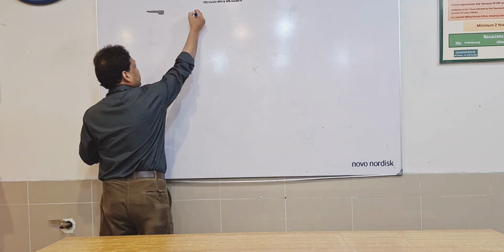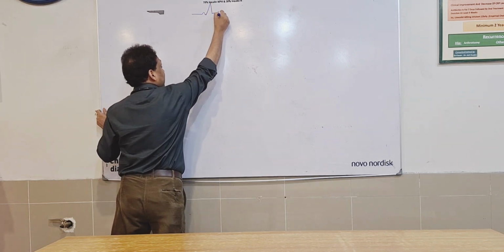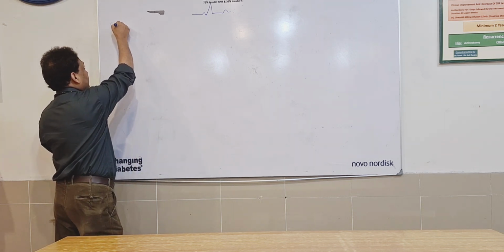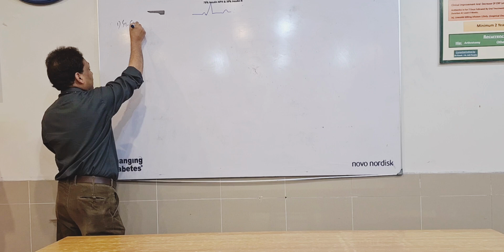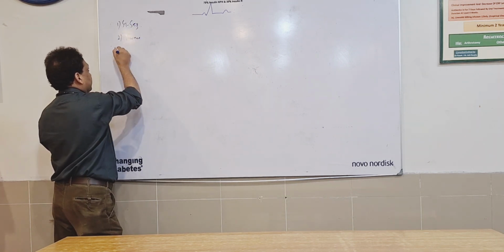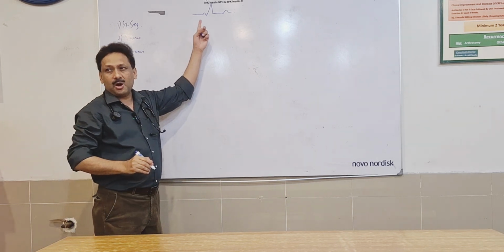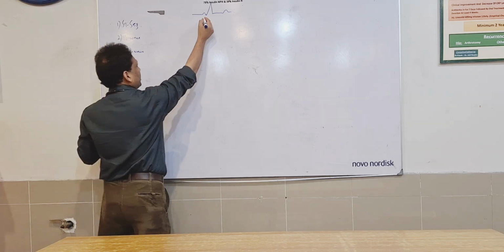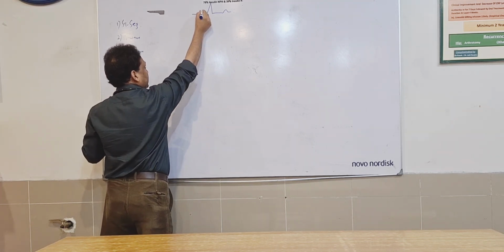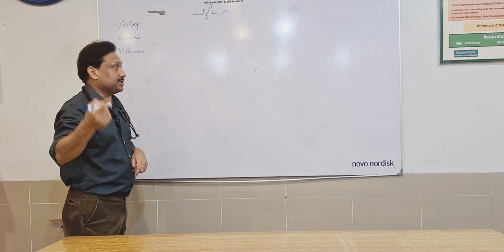As I draw the ECG here, so that you would know about all these components well, as we are supposed to discuss today: one, ST segment; two, T wave; three, Q wave. You should know how they look in the ECG waveform. Talking about the Q wave, this represents septal depolarization. So this wave is P wave, this is Q. This is known as the septal depolarization wave.